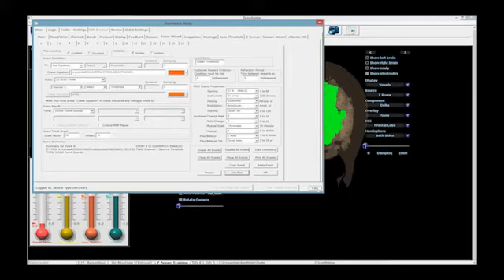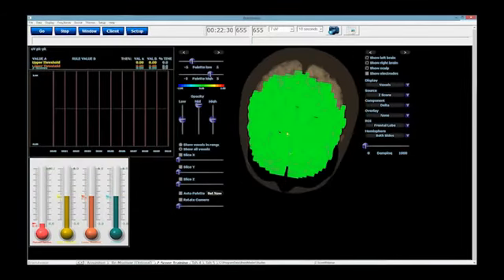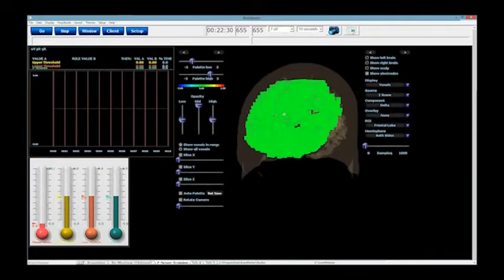Select ROI and select band. What they do is they work with the actual head map that you have displayed on this screen right here, and it will change the component and the region of interest on the fly for training based on what you're actually viewing right here. So to explain it a little bit better, let's see it.